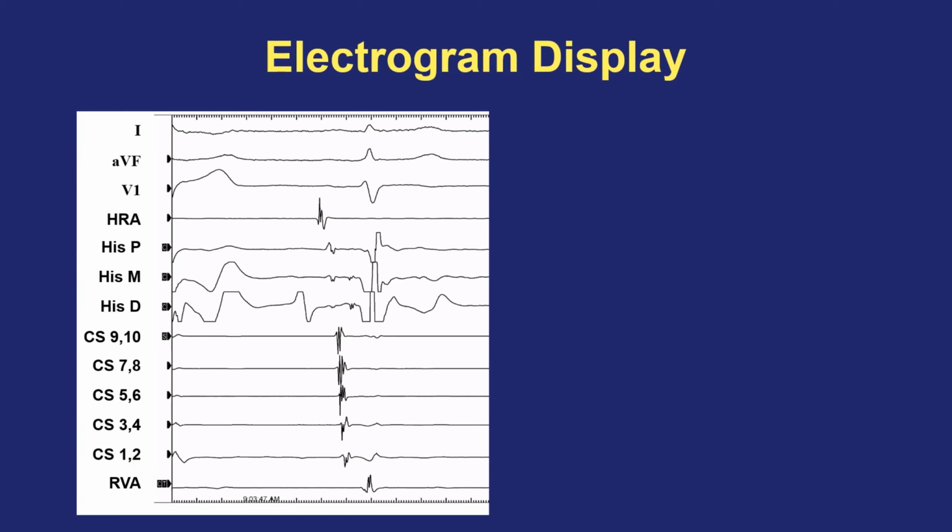at the bottom. Sometimes people will display the coronary sinus catheter with 9-10 at the top, because then you'll get a sequence that is top to bottom in terms of how sinus rhythm transmits across the heart. Other people like to use the numeric version and put 1-2 at the top, in which case the signals will have a bottom to top sequence in sinus rhythm.